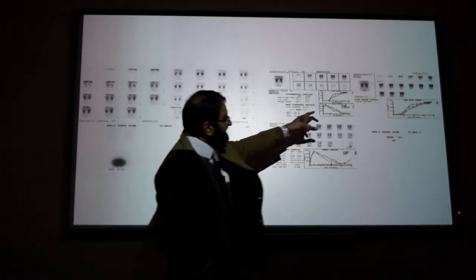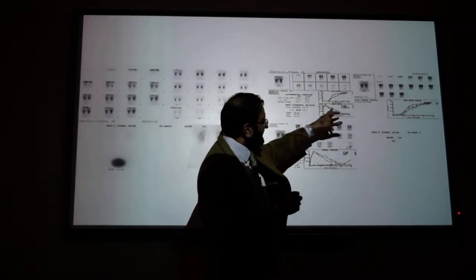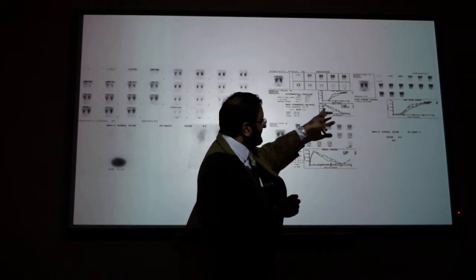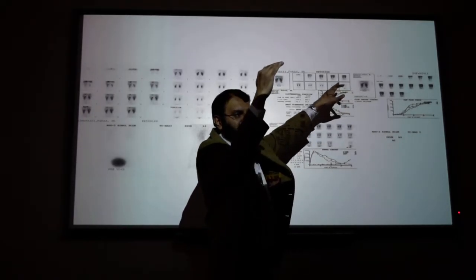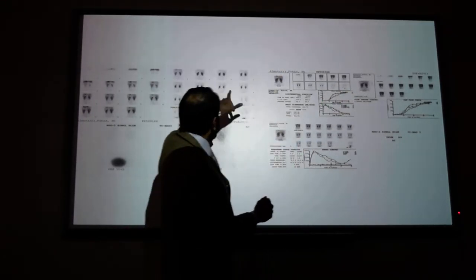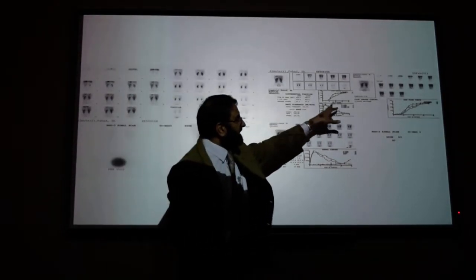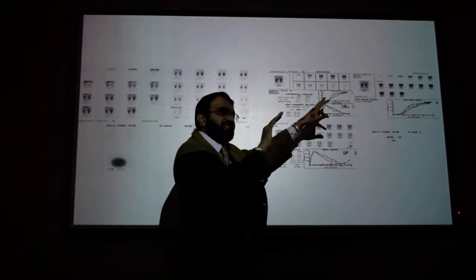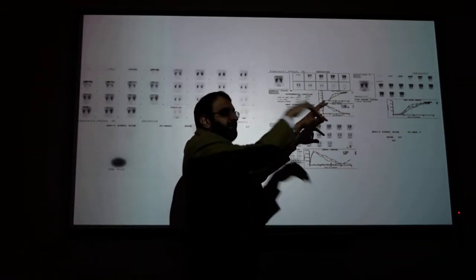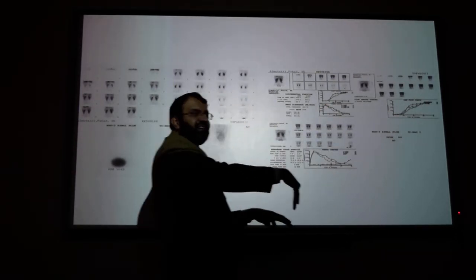Why? Because we get these curves. You see, the contrast or nuclear material that is injected is excreted. If it is not excreted, the curves go up. So this tells you there is obstruction. So we can derive these curves from these images. For example, this curve is going up. This means the tracer is accumulating in the kidney, not being excreted, whereas this one comes down, which means it is excreted in the urine. So this tells you the functional element.